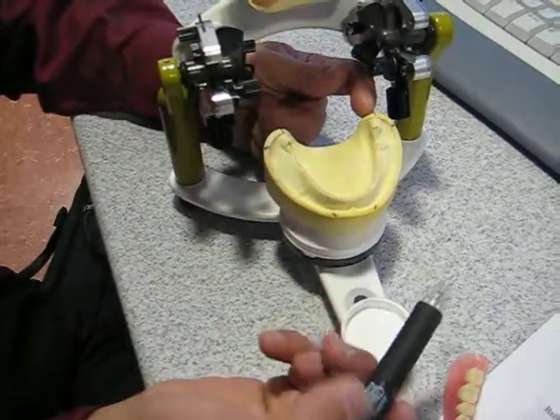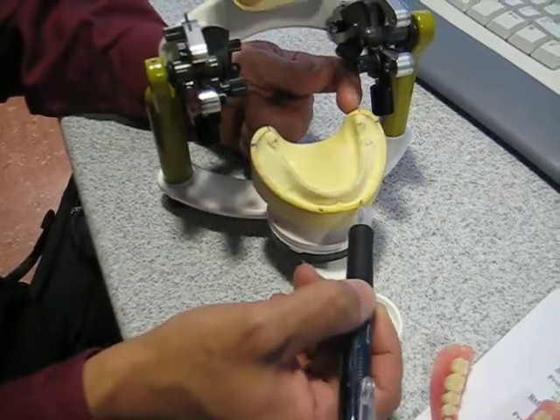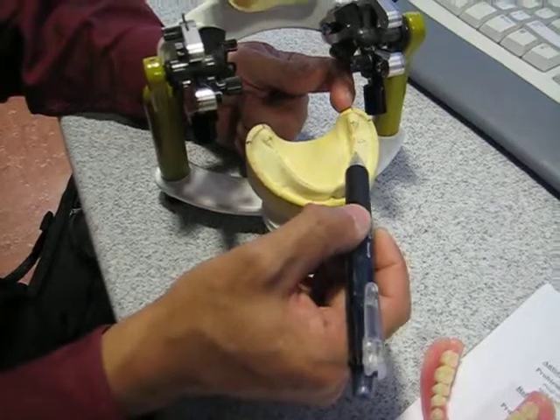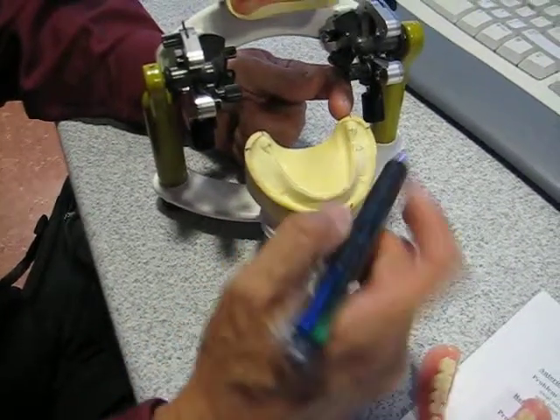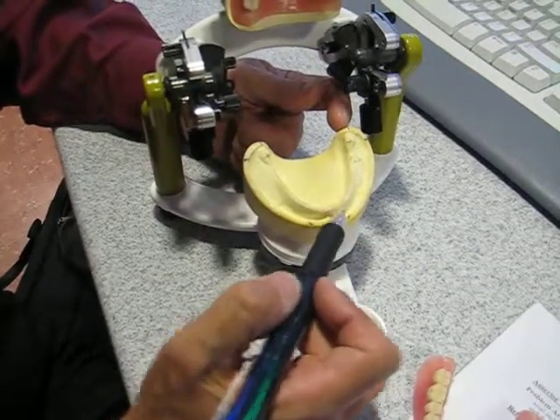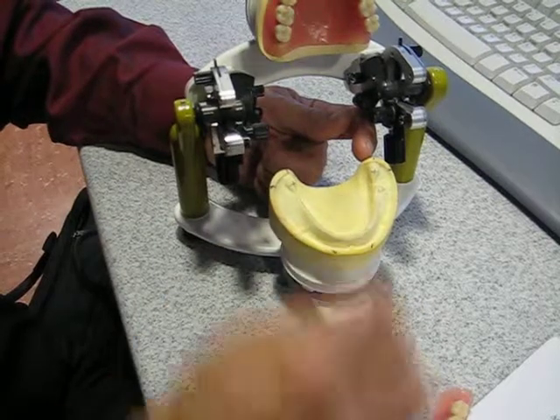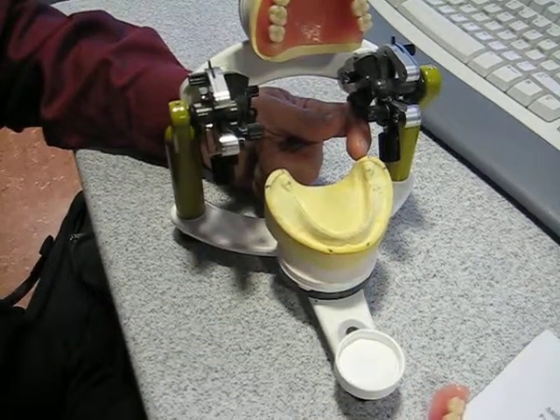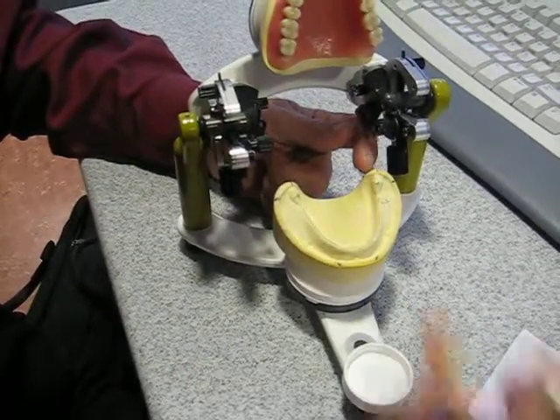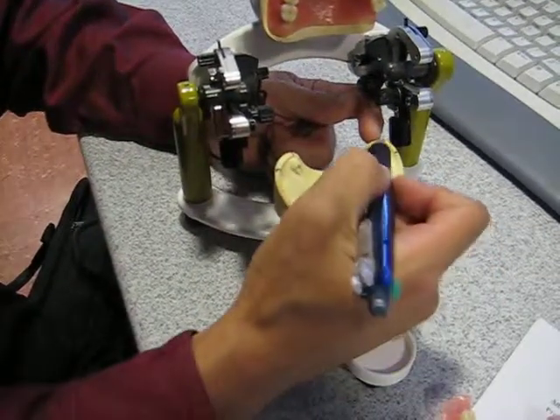Now, there's a limit as to how far lingual we can be because we don't want to impinge on tongue space, but at the same time, since the mandibular ridge crest tends to get a little wider in terms of arch form with further resorption, it's not uncommon for us to be slightly lingual to the ridge here.